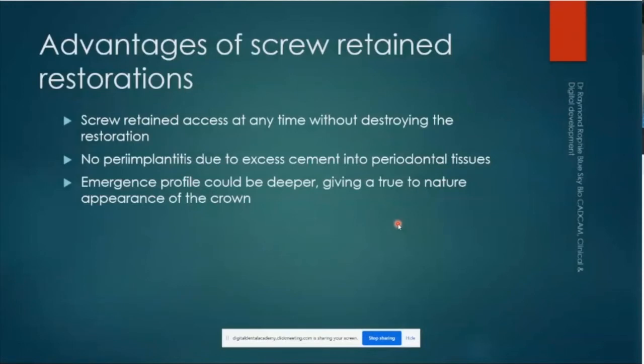And also, if you use these titanium bases and a screw retained restoration, you will not have peri-implantitis associated with excess cement in the periodontal tissues. Why? Because you will never cement the restorations intraorally.